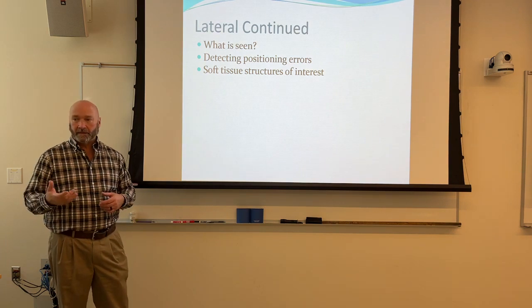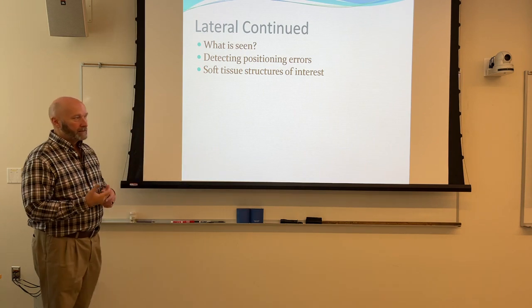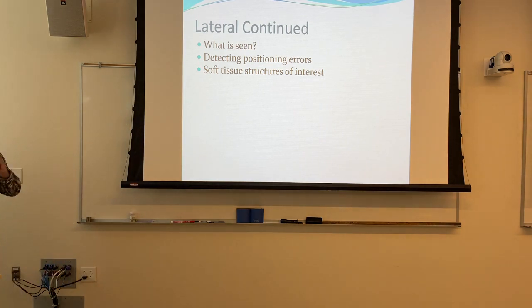Hangman's fractures, things like that, you're going to get a tremendous amount of swelling. So you have to be able to visualize that, you know, prevertebral fat pad. And really what you're looking for is displacement of the airway.